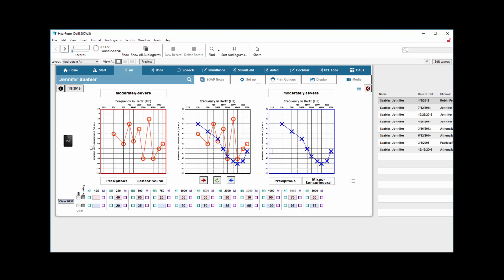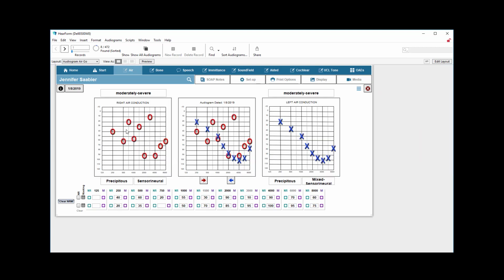And then also, if you're using an iPad or an iPhone, we don't have the ability to use this screen because plugins cannot load on an iPad or an iPhone. So we have to use an old-fashioned way of doing it, and that's where you would just click here with your finger, for example, or an Apple Pencil, and put the information in here. So it's not as advanced, but it does get the job done.